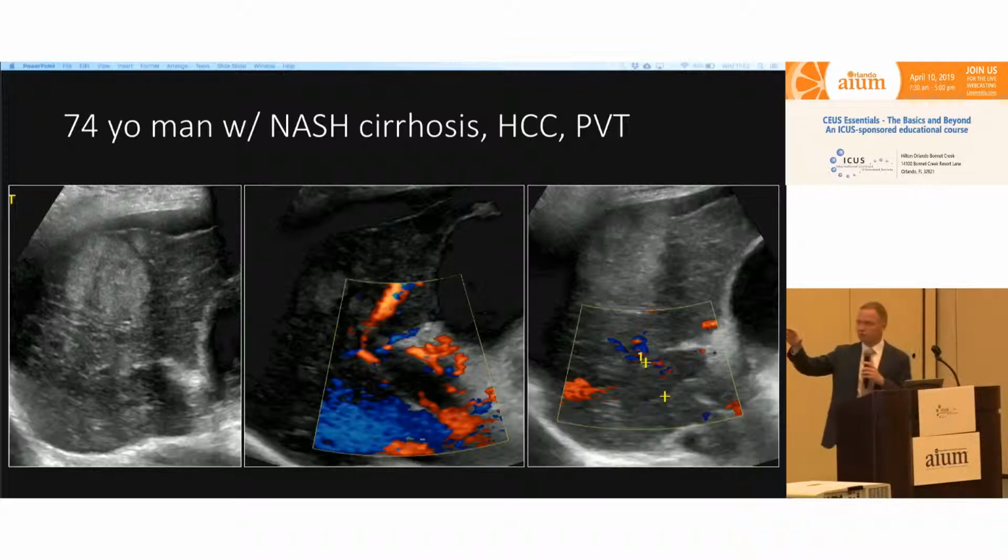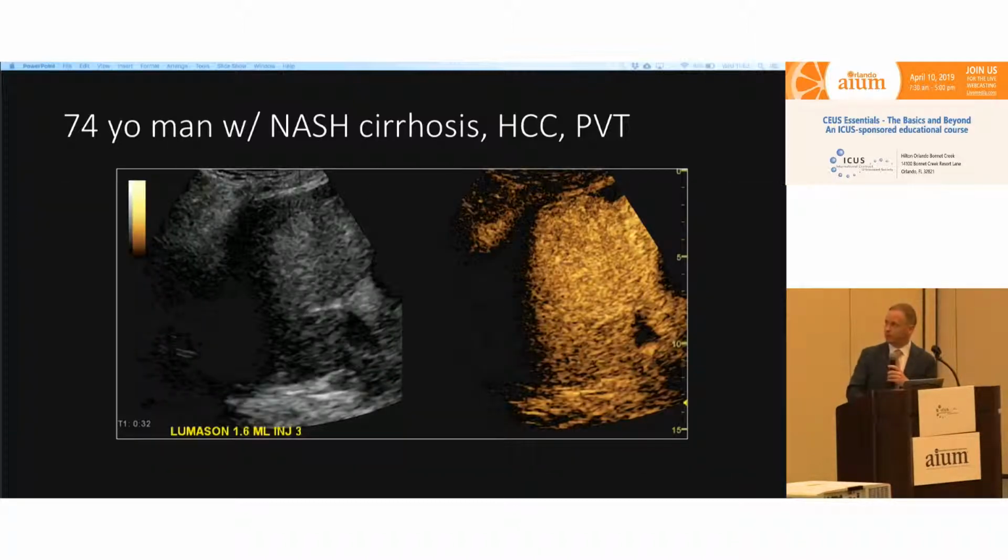I know that tumors are supposed to have portal vein tumor thrombus, but quite often those patients have significant portal hypertension, and they develop portal vein thrombus, just bland thrombus quite often. And presence of a little bit of flow along the periphery can be seen in chronic portal vein thrombus because they get recanalized, and you might end up with small flickers of color Doppler flow along the periphery. So to me, this is totally indeterminate. I would worry about tumor thrombus because this portal vein looks distended, but again, acute bland thrombus can look like this as well.